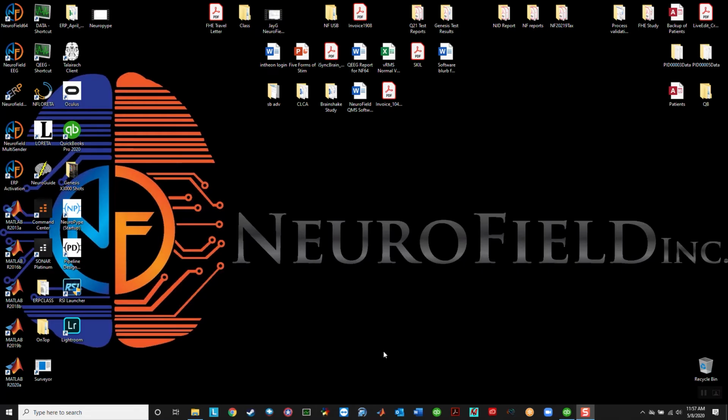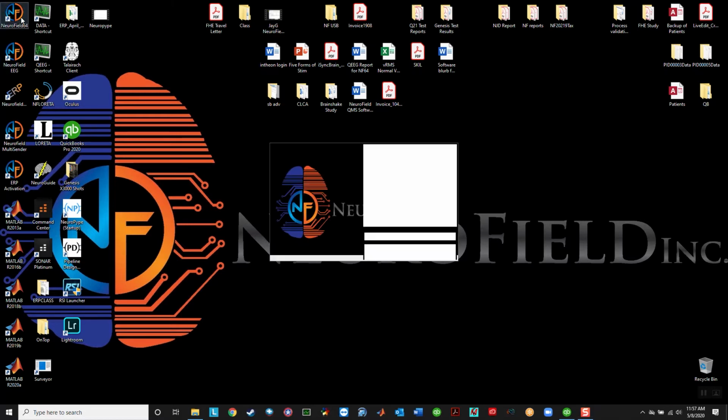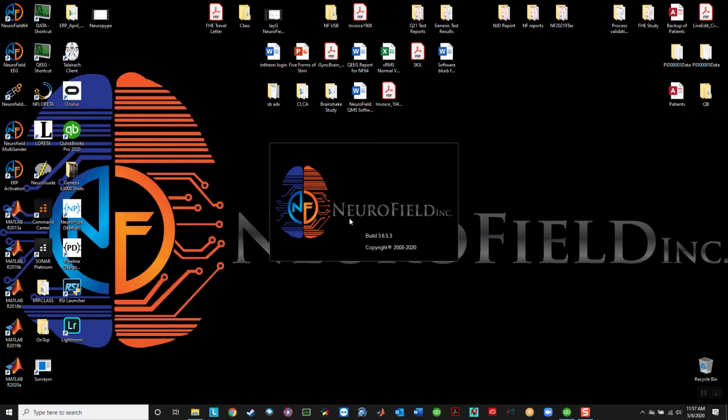Hi, I'm Dr. Nicholas Dogris, and I'm going to show you how to use the NeuroField 64 platform for conducting a synchronized neurofeedback and neuromodulation session. So you start NeuroField 64. The program fires up here.